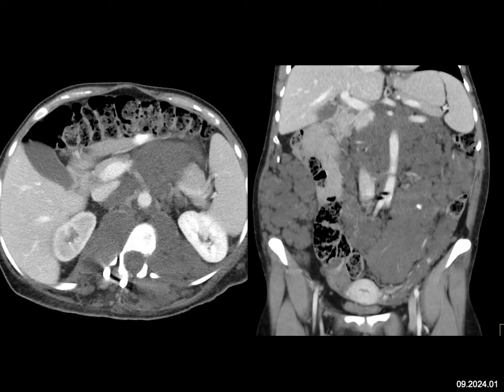You surely would think about lymphoma, but lymphoma is more soft tissue density. This is too low density. Testicular tumor can give you large cystic or solid nodes in the retroperitoneum, not this appearance, however. And this is really not carcinomatosis. It's infiltrating, it's extending downward, but not that type of carcinomatosis appearance. If you also look closer, you see there's widening of the spinal canal and there's artifact from hardware.